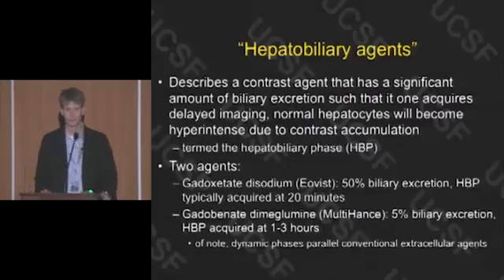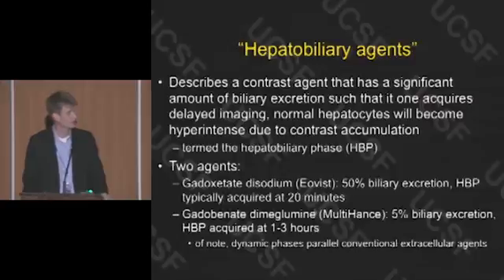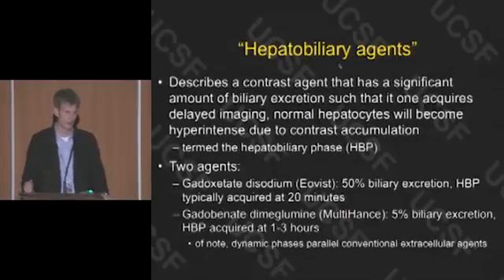And that obviously leads us to the topic of hepatobiliary agents. Now that we have Eovist, which was approved in 2008, 2009, hepatobiliary agents are much more commonly used to evaluate these focal lesions, particularly in young women. These agents are taken up by hepatocytes collected in normal hepatic parenchyma, so lesions that don't contain hepatocytes are going to be dark compared to the adjacent hepatic parenchyma. So they're incredibly helpful for things like metastases, and also on the opposite side, things like FNH.